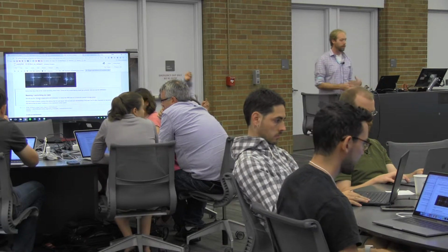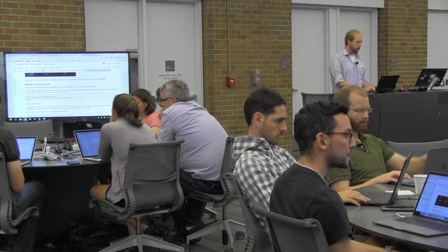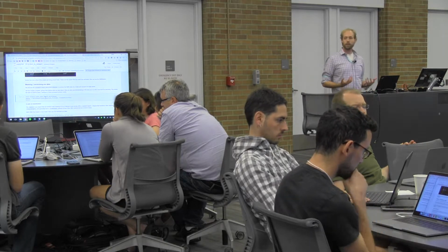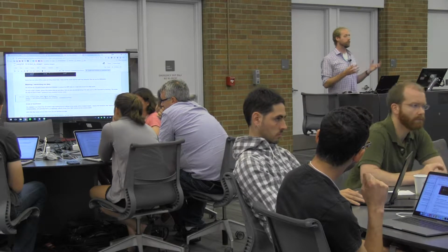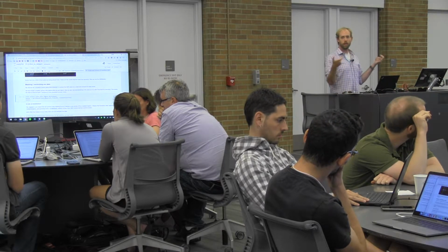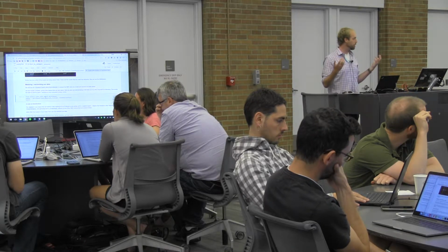And the way that we can combine this mask with our actual data is by using something called a Nifty Masker. So this exists in nilearn.input_data. And Nifty Masker is an object that can be fit to a mask, so that you can create with a mask. And what that does is give you back an object that you can run on a neuroimaging volume, and it will basically return a subset of the voxels in that volume, corresponding to the mask that you want to apply.